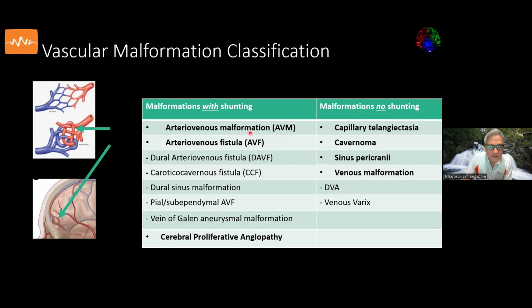It's not important for us to be completely able to tell these apart, but for the radiologists among you, these are the types of distinguishing marks that we will make. Here's an example of an AV malformation where the nidus in the malformed capillary bed shunts from the artery to the vein, whereas an AV fistula directly shunts from the artery to the vein without a nidus.